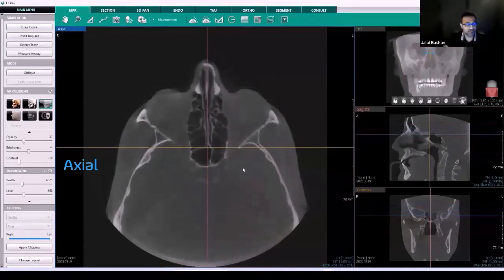Another common calcification is the carotid calcifications. And, as we all know, if we go through anatomy again, there's the common carotid, the internal carotid, all that stuff. But specifically in the skull base, just posterior to the sphenoid sinuses, you may note some radiopacity, and that could indicate a calcification of the internal carotid artery.